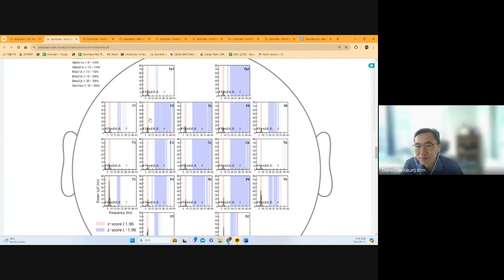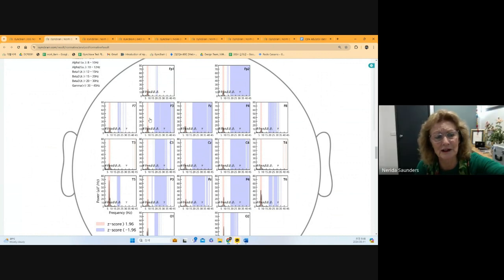It's beautiful, but I just wondered, do we go too high up to 80 there? If we could take that down to 50 and expand this more so that it's more visible, the shape of the power. I don't know if it's possible or not, but I know that's separate to what you've just shown us, which is fascinating.